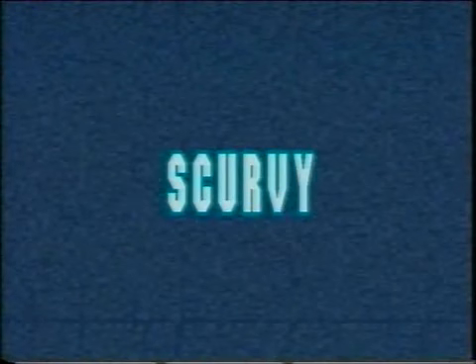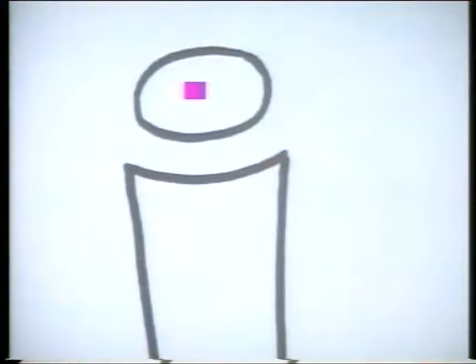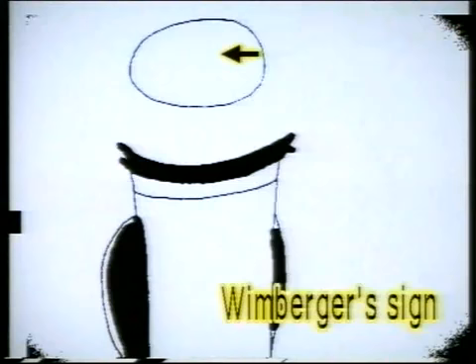Scurvy. This is the normal end of a growing bone with epiphysis, growth plate, and zone of provisional calcification and metaphysis. In scurvy, the cortex becomes thinned with ground glass appearance of the shaft due to loss of trabeculae. The epiphysis is smaller with thin penciled cortex and osteopenic bone. This is termed as Wimberger sign.